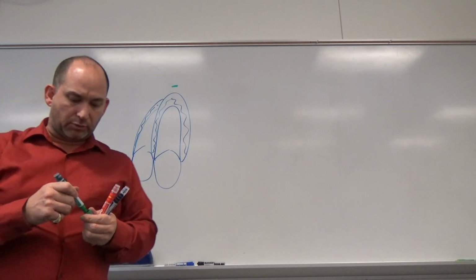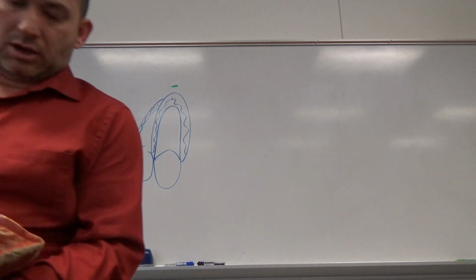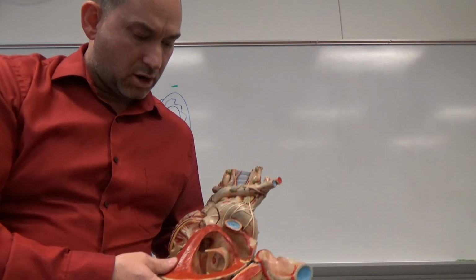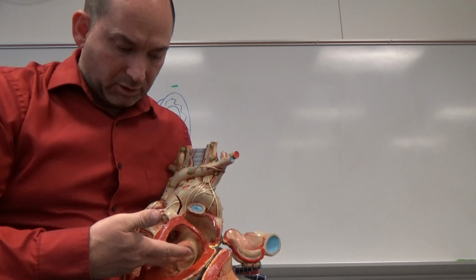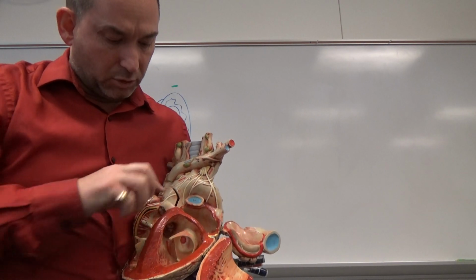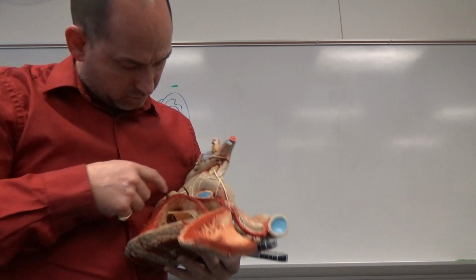Remember that if we're looking at the tricuspid and mitral valves of the heart, you can see on the heart model, if we're looking at those valves, we're at the posterior aspect, which is near the spine. If we're looking at the semilunar valves, which are kind of up underneath here, so they're up a little bit anterior, so when I tip up, that's when we see those.